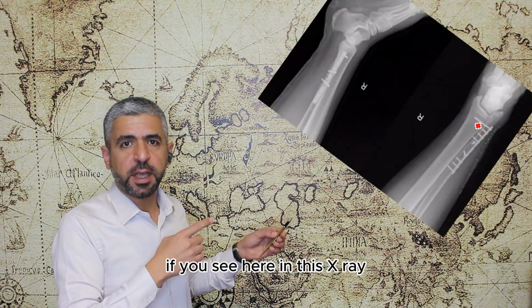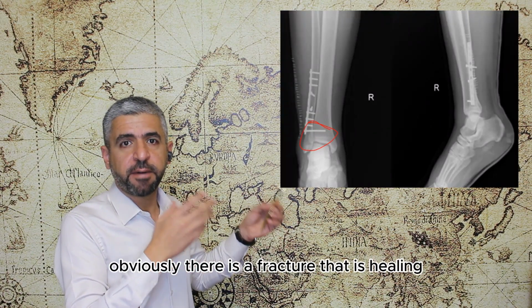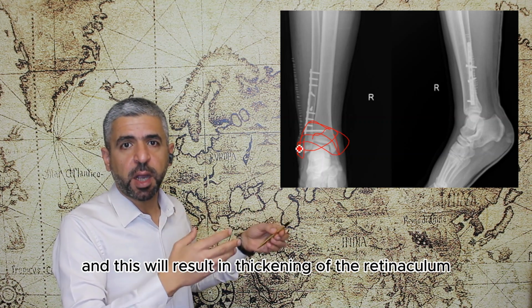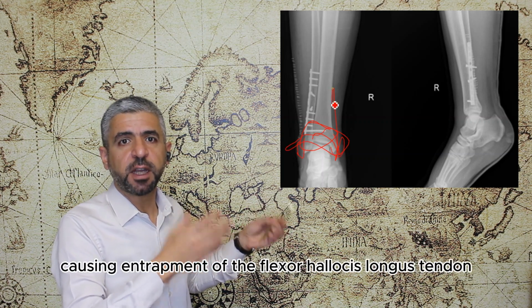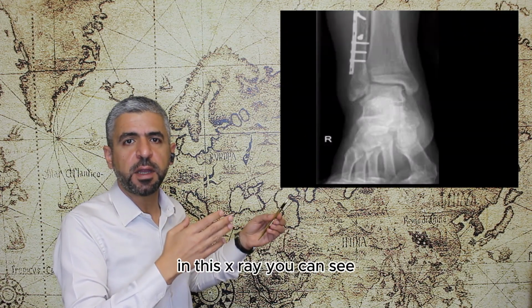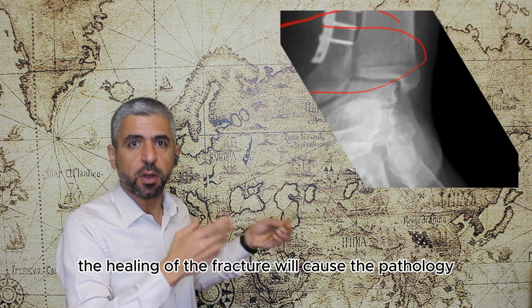If you see here on this X-ray, obviously there is a fracture that's healing, and this will result in thickening of the retinaculum, causing entrapment of the flexor hallucis longus tendon. Again, another example, in this X-ray, you can see the healing of the fracture will cause the pathology.